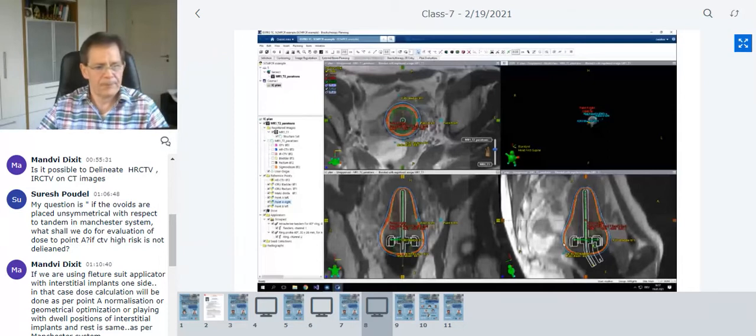And it has a pear-shaped dose. So actually, something that we could start with. So let's look at our tumor volume.